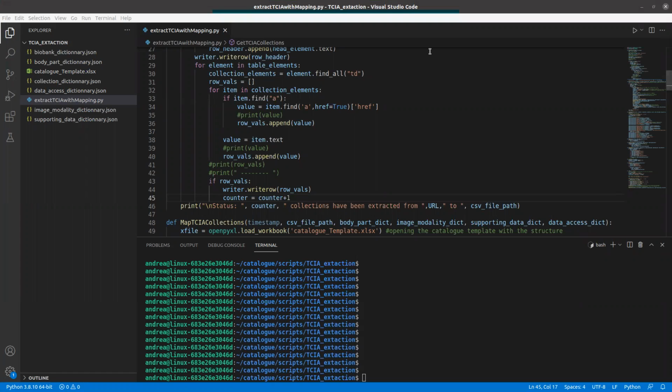Okay, so let's start with this video. We're going to look at how we are extracting information with TCIA. I'm going to show how to do it, and on the way we're going to find some bugs and fix them, and let's see how this goes.